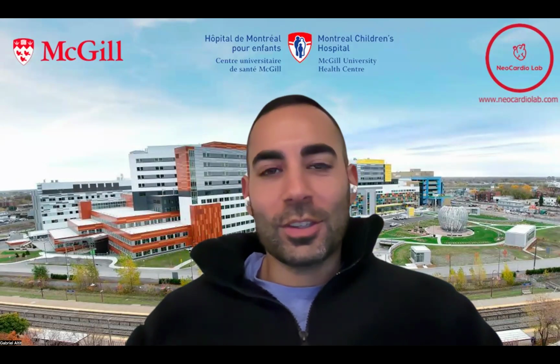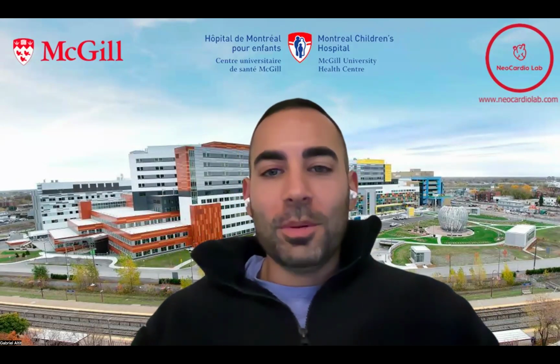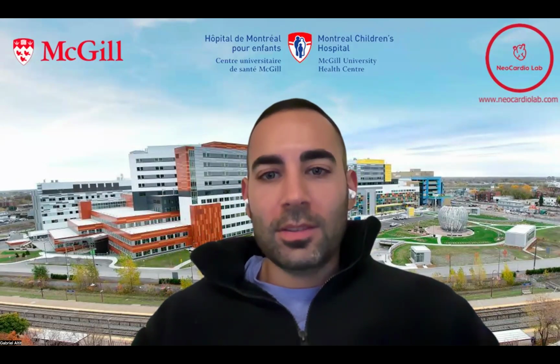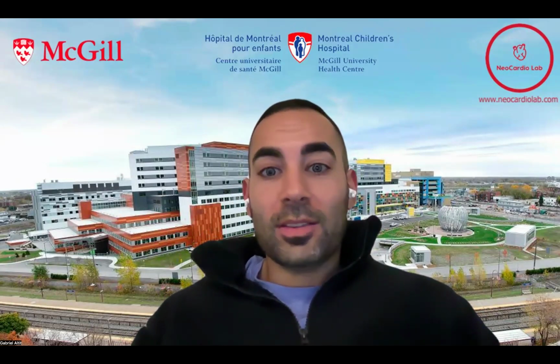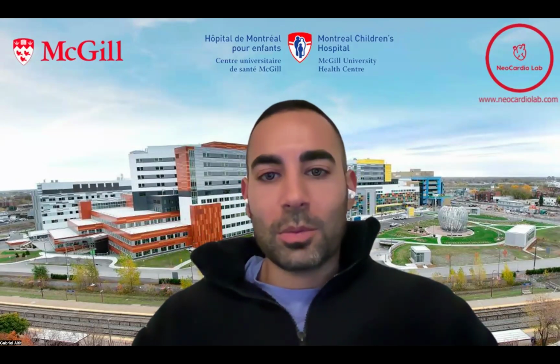I'm a neonatologist at the Montreal Children's Hospital, and I run the neocardio lab with the rest of the team. And today I'll be presenting a case for our case presentations. Instead of typing up the case, I decided to go over some of the image clips we acquired and go over some of the physiology to discuss an interesting finding.